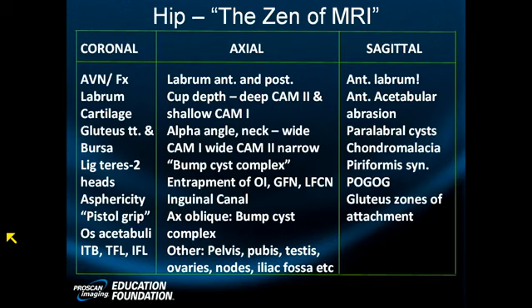You'd say there's a muscle tear. Then you might have to ask yourself another question. Like, what is going on in the vastus lateralis? There's low signal intensity anterolaterally. So we have a subacute hematoma in the back, in the biceps femoris, and a remote ossified, calcified, hemosiderin-laden lesion in the vastus lateralis.